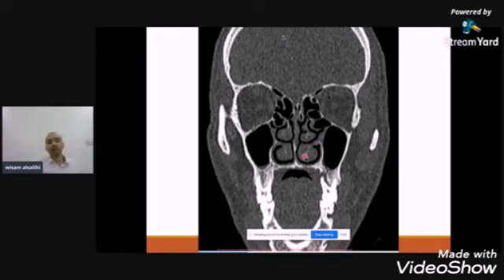We go more posterior, see this picture: this is the maxillary sinus, inferior turbinate, and this middle turbinate curves laterally to the lamina, and this is the basal lamella. So this is the anterior ethmoid, this is the posterior ethmoid. Still, the anterior ethmoidal artery lies in the mesentery. It's very clear.